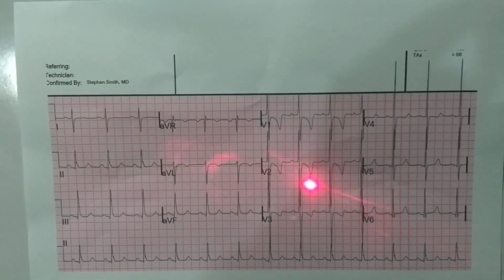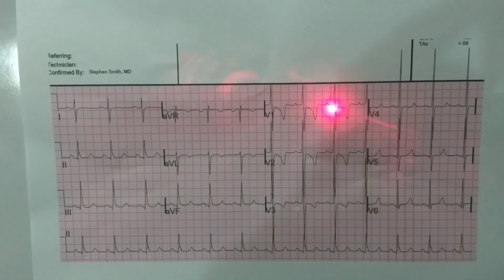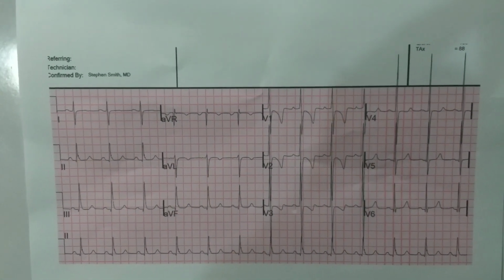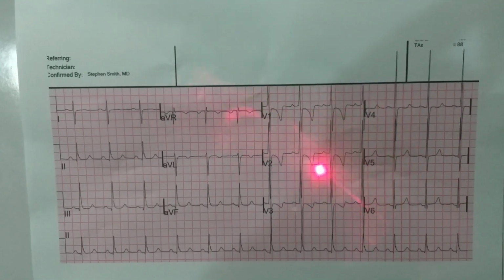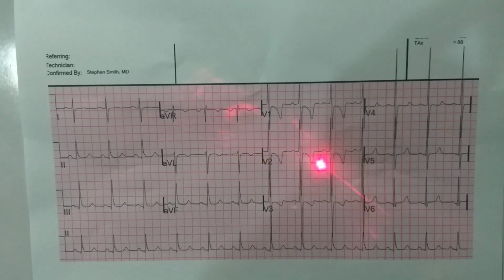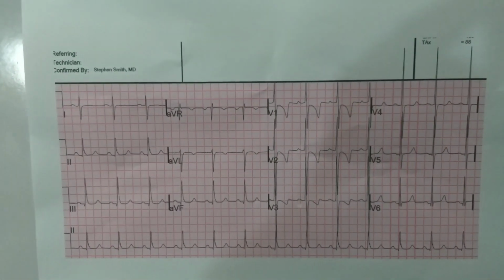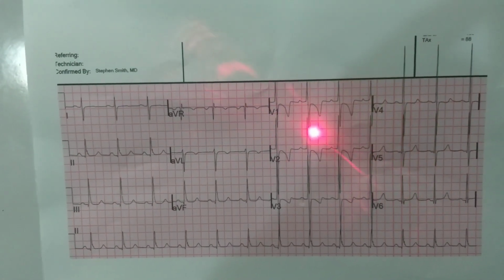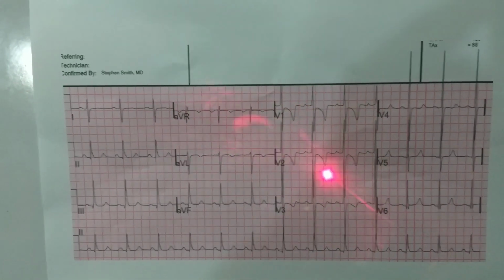So when a patient comes with chest pain and you get an ECG like this one, and with the chest pain there is restlessness, irritability, sweating, shortness of breath, and if there are ECG changes like this, you need to send cardiac enzymes, and you need to manage the patient according to the acute coronary syndrome protocol if you clinically suspect that this change is related to the patient's presentation. So this is T-wave inversions.